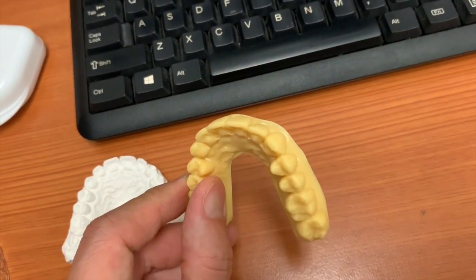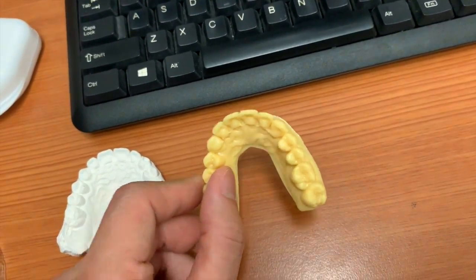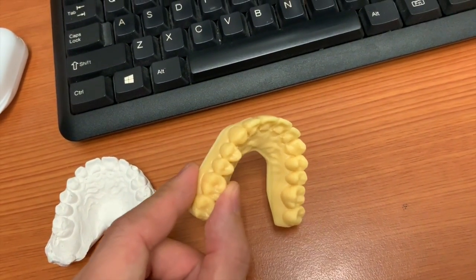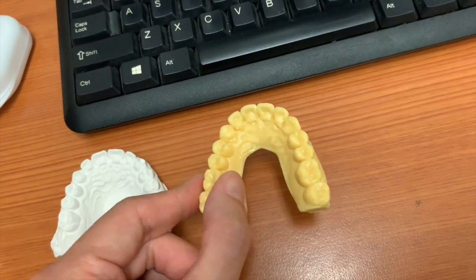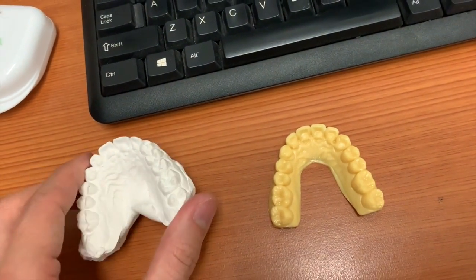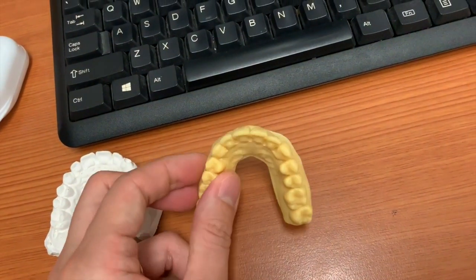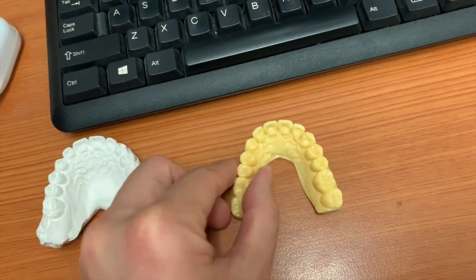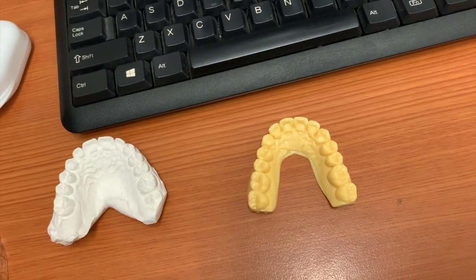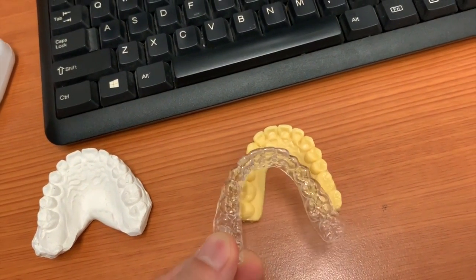What it means is generally you can keep these. When we provide this to you, we will normally bubble wrap it for you. These are plastic models, whereas these are made of plaster or stone, so they tend to chip or break. If you bring them in, let's say a minor mishap happens and you lose your retainers, then we can generally make these retainers again, made to fit your teeth in the same positions as when you handed them off.